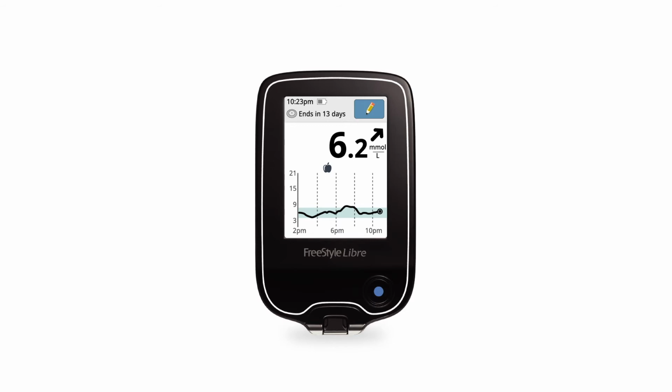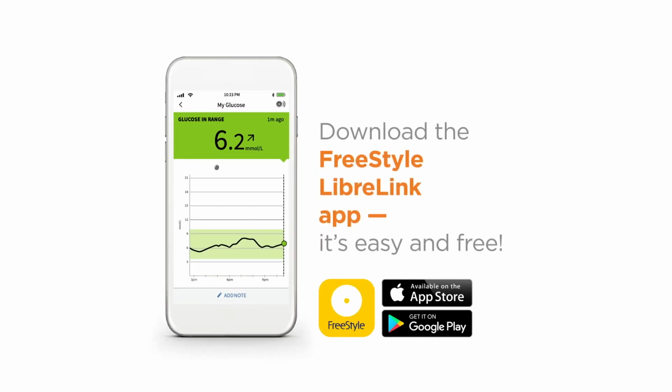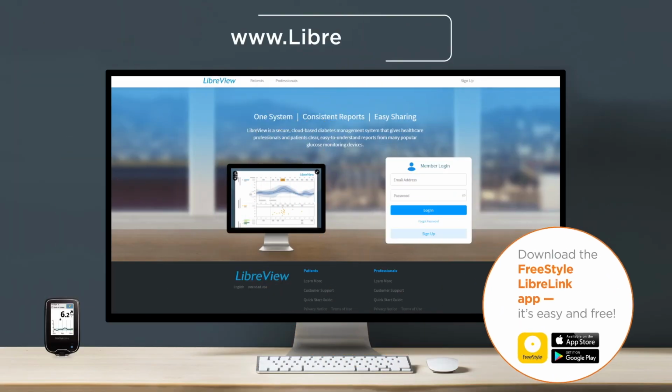If you're using the FreeStyle Libre reader, there are a few more steps to complete before connecting with your healthcare provider. So consider downloading the FreeStyle LibreLink app. It's free. To begin sharing with your reader, you'll need to sign up for a LibreView patient account.